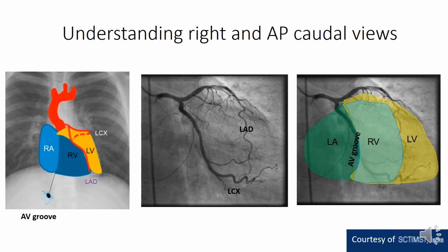For more orientation about the heart chambers, here is the LAD running in the interventricular septum, separating the right ventricle from the left ventricle, and here is the circumflex running in the AV groove, separating the left atrium from the left ventricle.